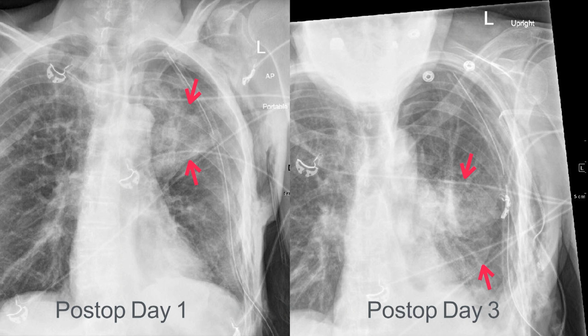On post-op day 3, we now see a shift. So this area of opacity has now shifted more into the mid and lower aspect of the hemithorax. And this is concerning. This is one of the early indicators that the lung may actually be torsing. Now, it's not uncommon post-thoracic surgery, particularly related to the lung, for there to be some kind of shift or reorganization of the lobes. They may shift in some orientation, but this is a bit dramatic.